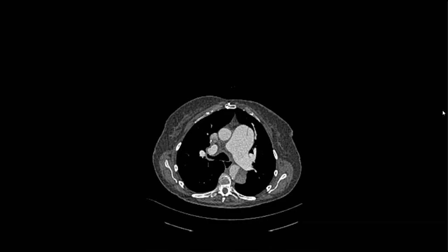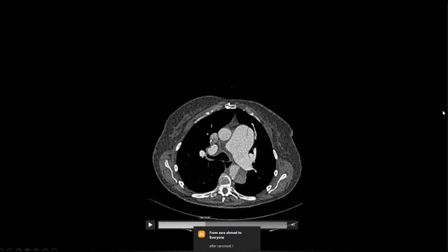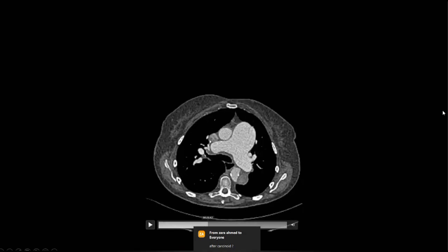Yes. So this patient had a type A dissection. Can you tell me the types of dissection quickly? Yes, sir. Stanford type A, in which the ascending aorta is always involved, and Stanford type B, in which only the descending aorta is involved. But whenever there is ascending, think always about the descending.